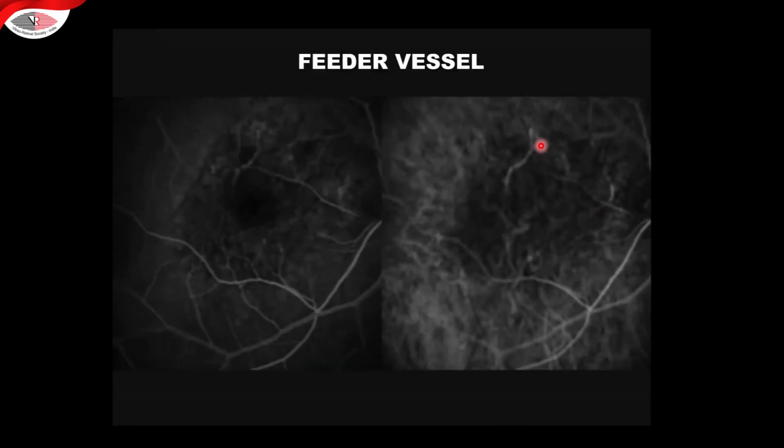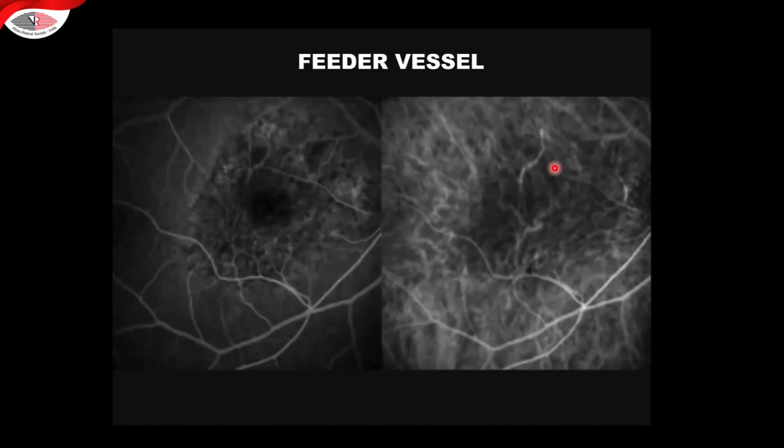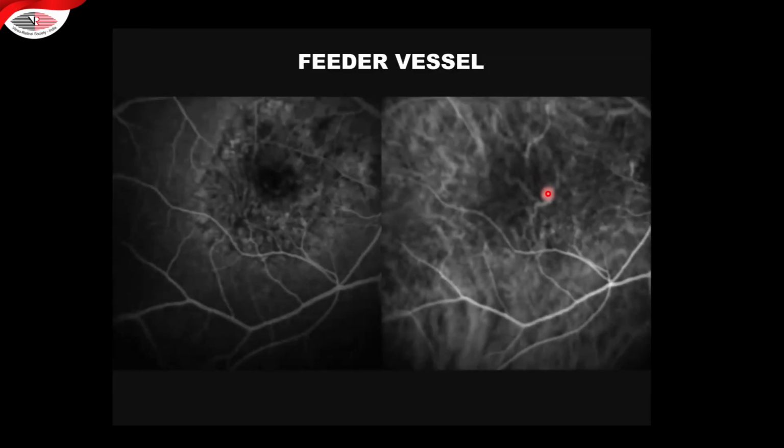This is another example. You look at this particular channel here. In the first 8 to 10 seconds of the dye injection, you'll start seeing these channels, which are the feeding vessels for a neovascular membrane.